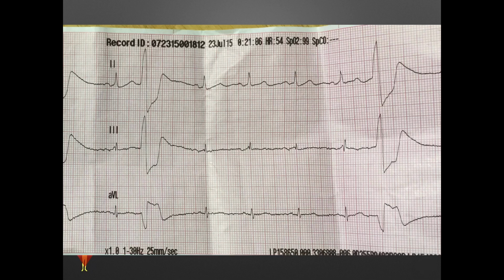So again, not getting caught up with what the computer necessarily tells us or spits out at us right away, right? We look at that underlying rhythm. The rate is where it needs to be. We have P waves. We have a P wave for every QRS complex. The rhythm seems fairly regular, except for these big ugly things that are popping out at us, right? And that's what we would identify as a PVC, or a premature ventricular complex. And they pretty generally look just like that, big and ugly, and they just kind of obscure the rhythm that we're looking at. But our underlying rhythm in this case, and when we're trying to identify that PR interval, what are we looking at? Well, it looks good. It looks like it's within its appropriate range.